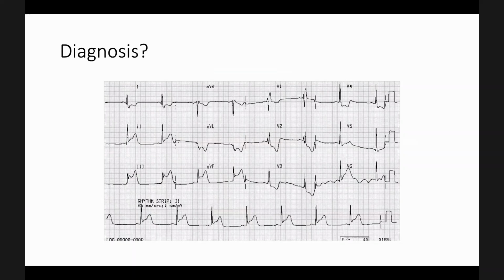So now you all have to tell what the diagnosis is. When you are given this ECG, the first thing is to read the ECG and see whether the patient is in sinus rhythm or not. Is this patient in sinus rhythm or not?